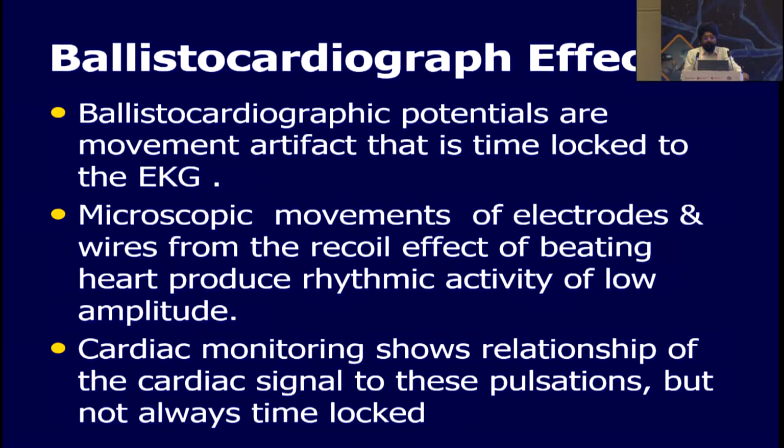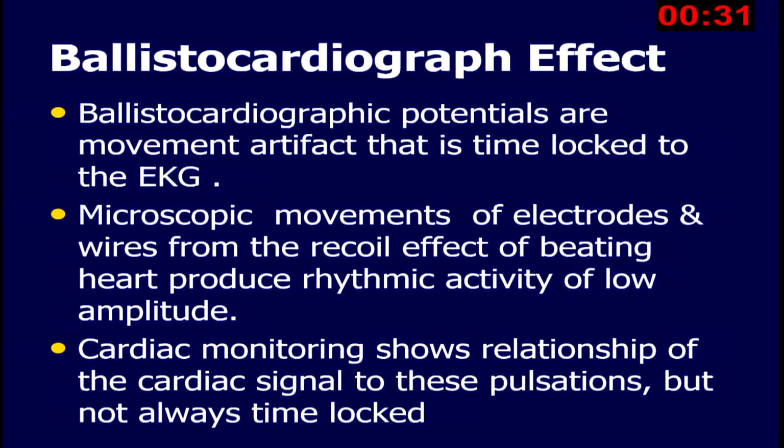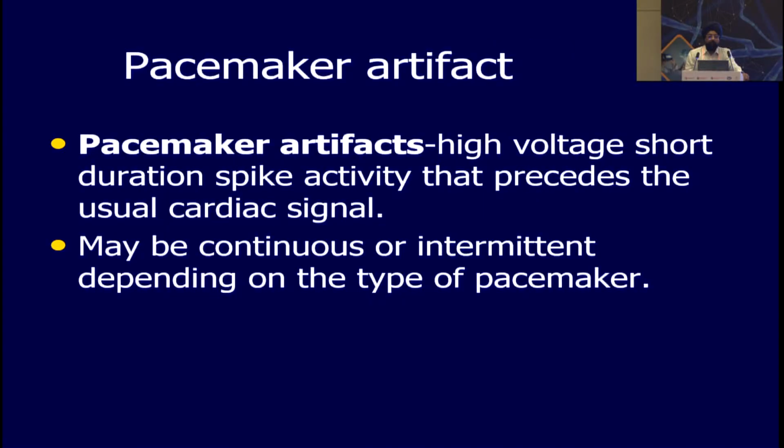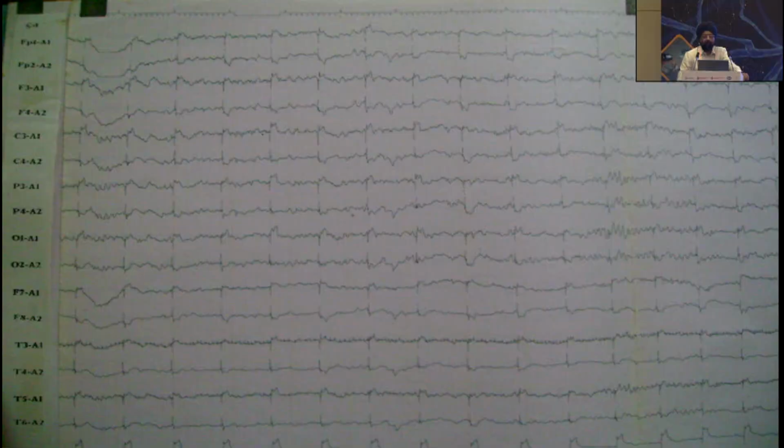Ballistocardiograph effects are actually potentials which are movement artifact, time locked to the EKG: microscopic movements of electrodes and wires from the recoil effect of the beating heart produce rhythmic activity of low amplitude. Cardiac monitoring will show the relationship of the cardiac signal to these pulsations, but they are not always time locked. Pacemaker artifact is high voltage, short duration spike activity that precedes the usual cardiac signal, and may be continuous or intermittent depending on the type of pacemaker the patient has. So this is pacemaker artifact.